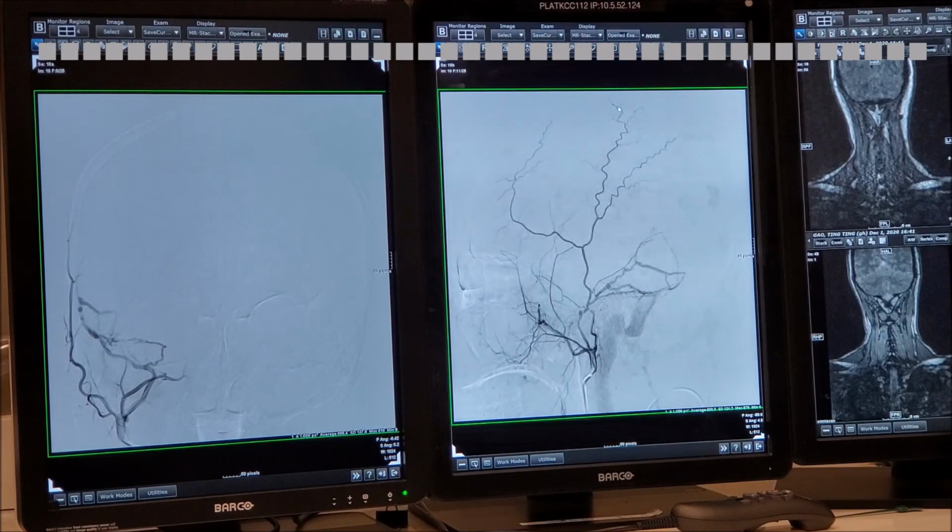Remember what we went over when it goes beyond the bone? It's superficial temporal, so it's a scalp blood vessel, right? If I can't figure it this way, I figure it backwards. And remember when the superficial temporal comes through the zygomatic bone, it gives you a curve, because it has to come from a deep position to a superficial position.